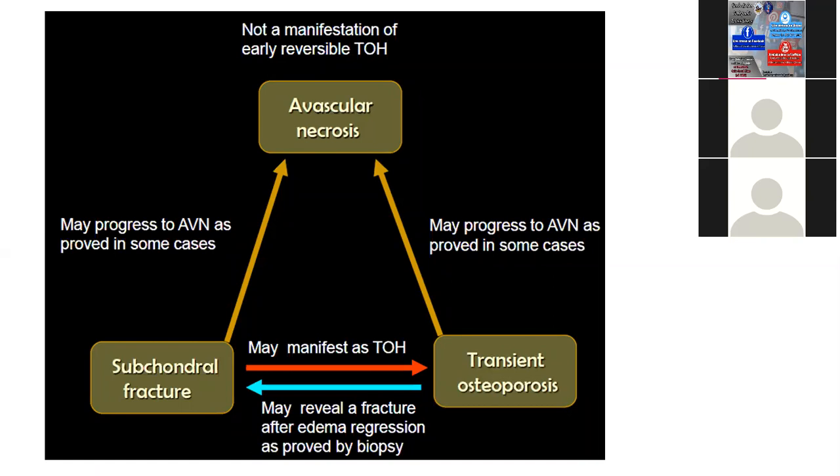But we have certain items. If we have any crescent line obscuring some of the edematous area, we are looking for that. Is it concave or convex? And then we can give intravenous contrast to solve this problem.